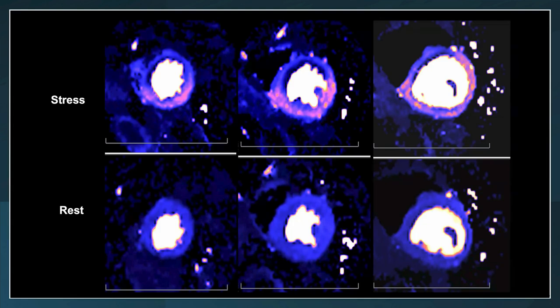There is a good amount of hyperemia, suggesting the regadenoson vasodilation actually worked. What is not clear from the qualitative images but is shown in the quantitative perfusion mapping is a second hypoperfused area in the circumflex territory. So this is not just LAD ischemia, but also circumflex ischemia.